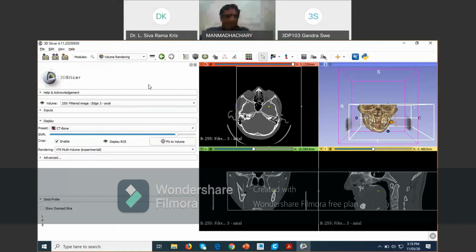One question: I have done the same thing as you said, but didn't get the 3D model. What would be the problem? Are you able to see the chat box? Participants are unable to get the skull image, sir. First let Chari explain the fundamentals, then you will start again from scratch, completely. Okay, we will continue.